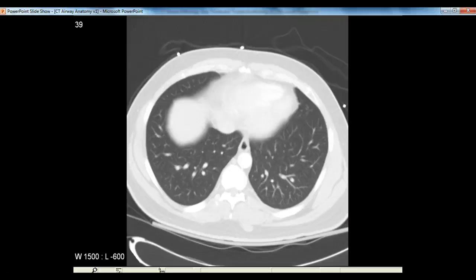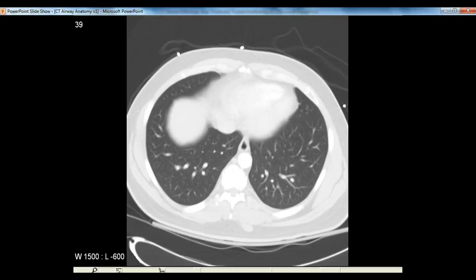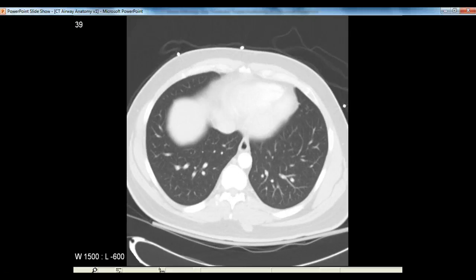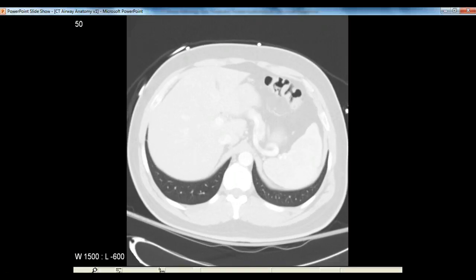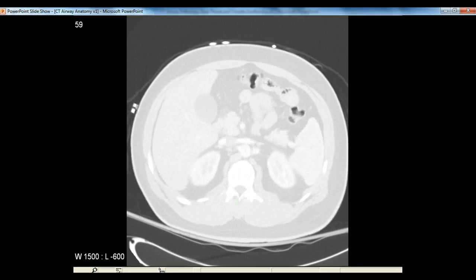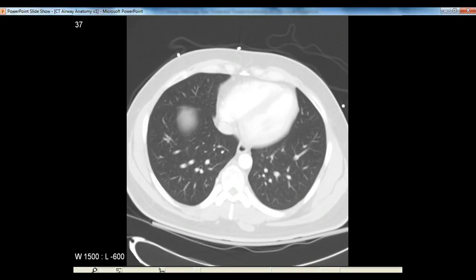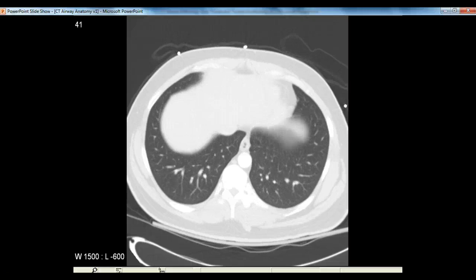You come down and it's held open a little more. Now we're getting anteriorly this sort of fuzzy gray structure. What's that? That's the diaphragm. That big slip of muscle. It's attached anteriorly at the bottom of your ribs, and posteriorly it extends much more inferiorly down to the ribs in the back. So your lungs essentially end anteriorly more or less at the inferiormost rib, and your heart ends there, the diaphragm comes across. But posteriorly the lungs continue to extend down quite a bit more.